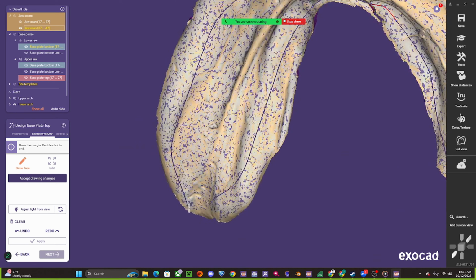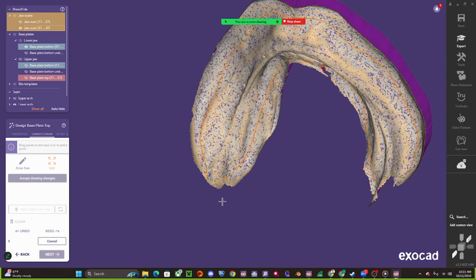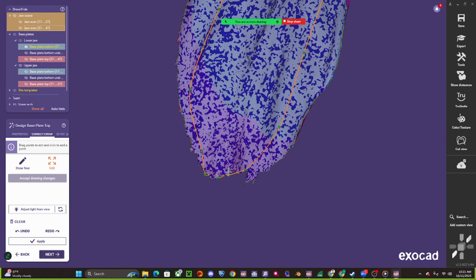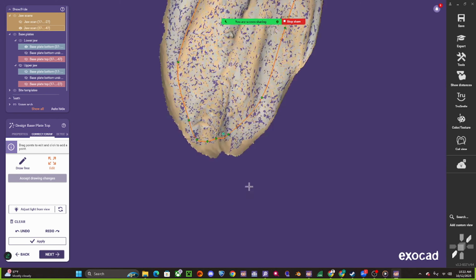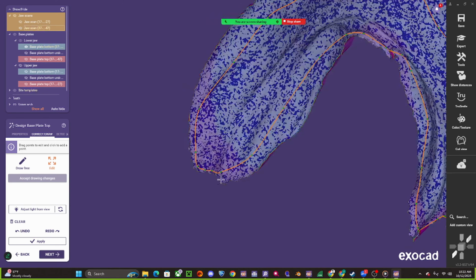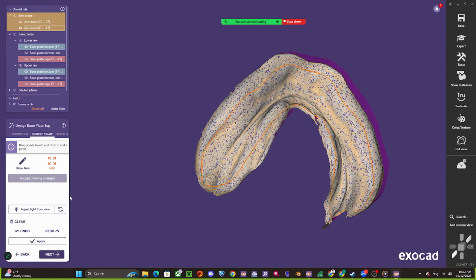All right, and then this pad back here is looking pretty good. And then I will fuse it by double clicking on that last dot and it'll fuse. Now if I see something I don't like, I'm going to adjust it. So our virtual wax up bottom got cut off here, so that's why our jaw scan didn't extend there. So it's something to look at when we have our overhang, right? Our overhang didn't even include there, which is fine. We got most of that pad back there.